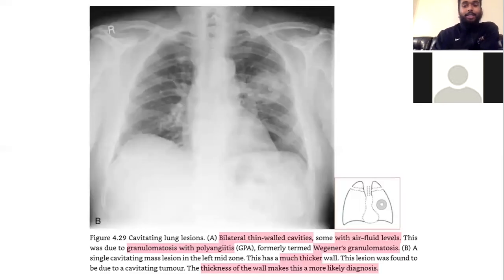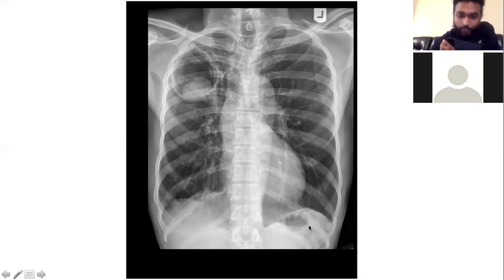It's messed up. Okay, wait, would this be a good X-ray? What are those criteria that what's his name, Astro, whatever his name is, gave us about what's a good X-ray? This X-ray just looks different from other X-rays. I think the X-ray is just too strong. I think what you're supposed to see is the lungs are black, but the bones are white. If they don't put enough, I call it juice, in the machine, then the lungs look white, and the heart and everything else looks really white. But if they put too much juice, even the bones start to look a little bit black. In this case I think it's just real high def. But if they put too much juice in, even these bones will start to look black, and you won't be able to see the pulmonary vessels because they'll wipe them out. It's just too much juice.